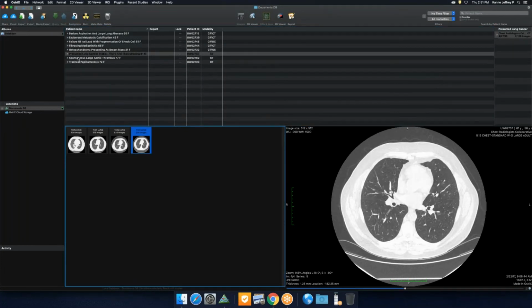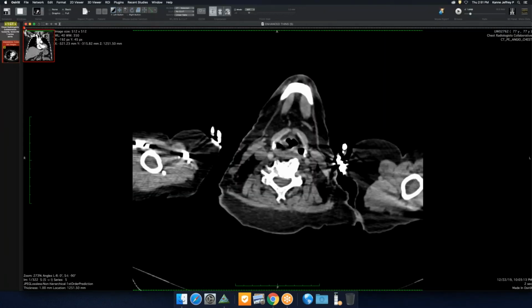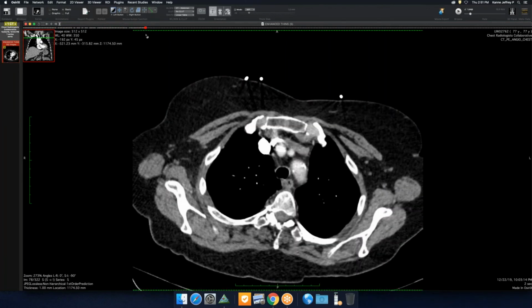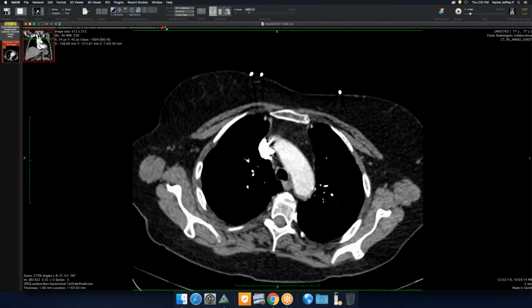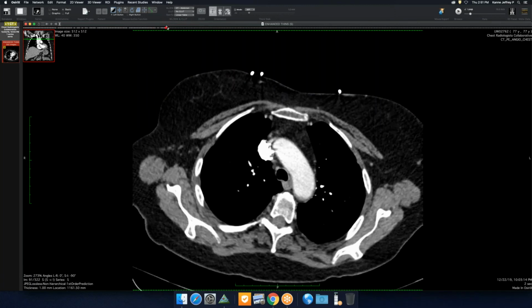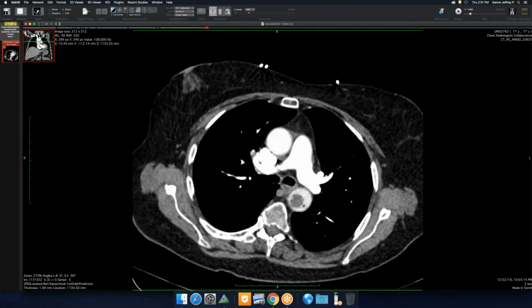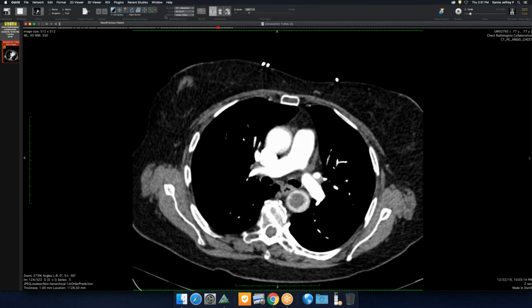All right, I'll show you guys this one. I think, Travis, I can't remember who I sent it to, but I came across this just recently. This patient has a known history of pulmonary embolism and is on apixaban, one of these new anticoagulants, and presented with this CT and has this huge thrombus, presumably a thrombus. It sure looks like one.